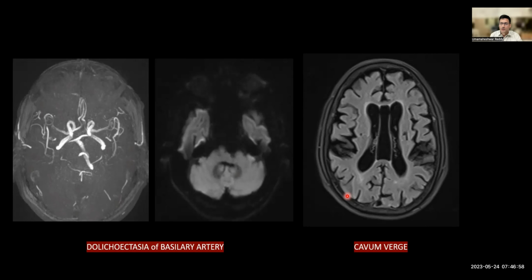You should make sure, as a young consultant or resident, you should always look at the midbrain to pons ratio to diagnose PSP. Sometimes it may be overdiagnosed if you don't have the exact measurement, because normally also there will be slight thinning of the midbrain at the mammillary body level. But you should always measure in the appropriate location to diagnose PSP.